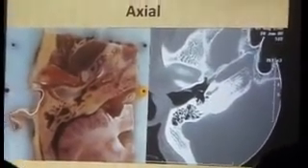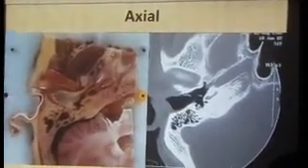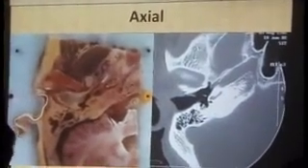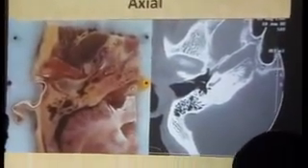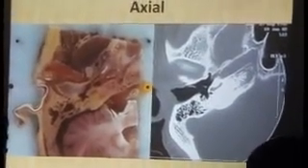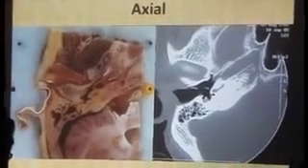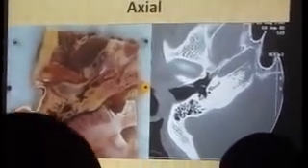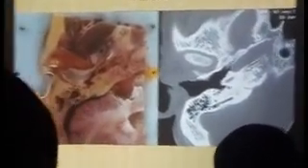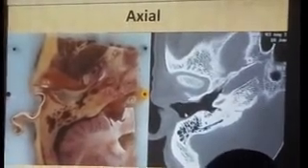Now, why is this segment important? This particular section becomes important for surgeons performing the cochlear implant. You need to know how much of a window you have between the tympanic annulus and the facial nerve, because that is where you are going to perform your posterior tympanotomy. And what is the kind of overhang that you have as far as the round window niche is concerned. Finally, everything disappears, no further ossicles visible, just the basal turn of the cochlea and an empty mesotympanum.